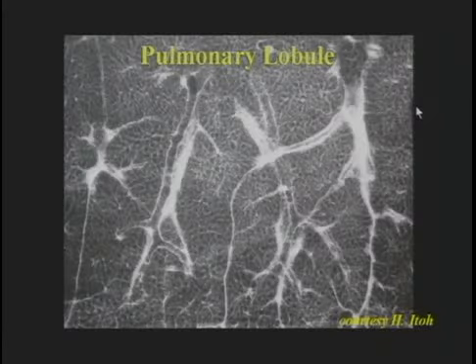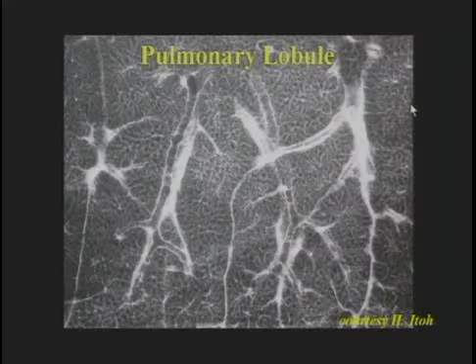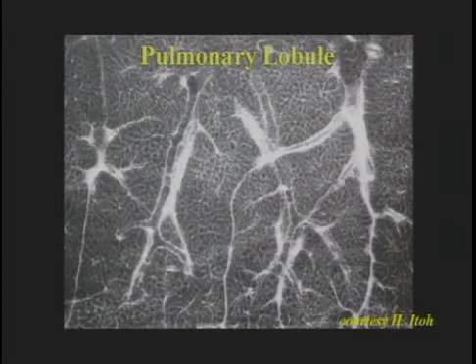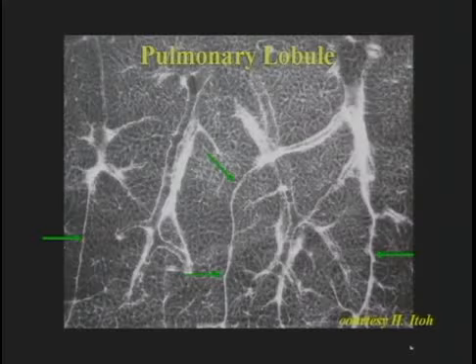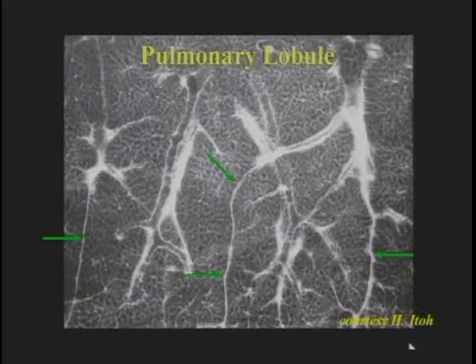Now I'm going to begin by briefly reviewing the anatomy of the secondary pulmonary lobule, some of the abnormalities we identify because of abnormalities of the pulmonary lobule. This is a radiograph of a lung slice of two adjacent pulmonary lobules. What we can see are the lobules being marginated by connective tissue interlobular septa. These contain pulmonary vein and lymphatic branches.